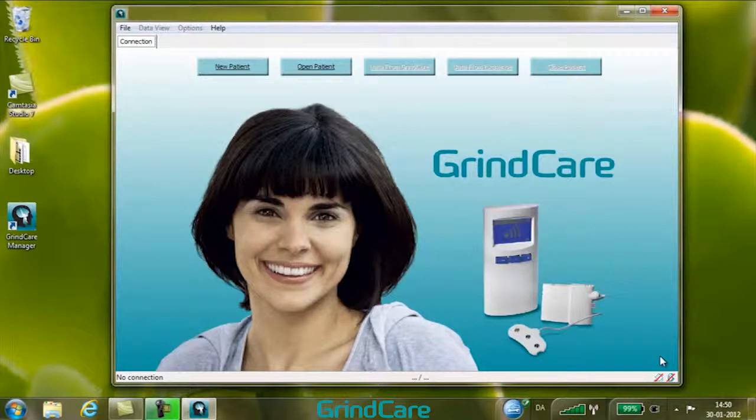When connecting a device, the text to the left changes to GrindCare Connected. In the middle of the bar, the number displayed to the left is the serial number of the stimulator, and to the right, the serial number of the GrindDock is shown. The red bars across the icons to the right also disappear.